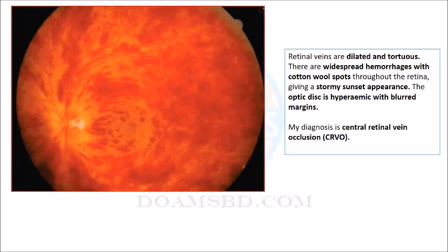Very extensive. This appearance may confuse you with hypertensive retinopathy. So today my plan is to go for a complete discussion. If you remain with me, I hope you will be passionate with me to finish today's chapter. In hypertensive retinopathy also there is hemorrhage, but not this much.